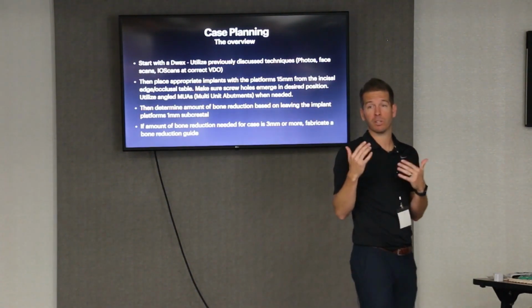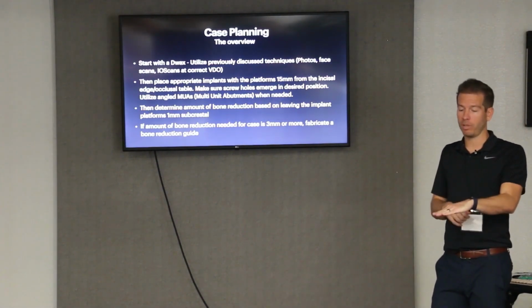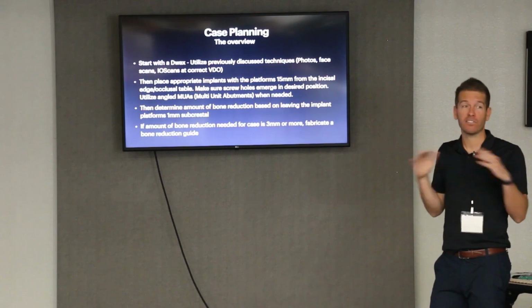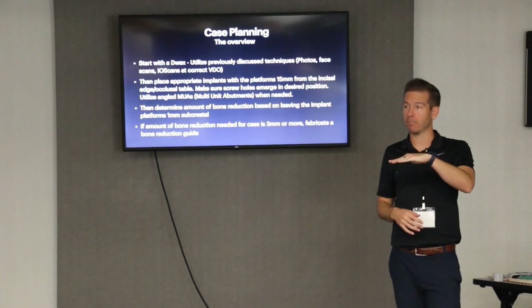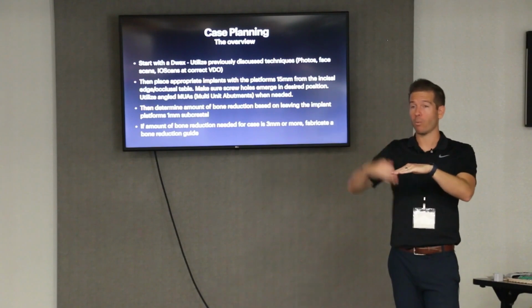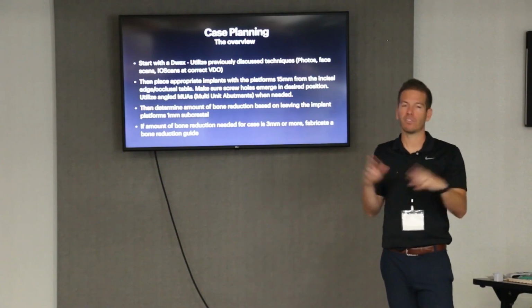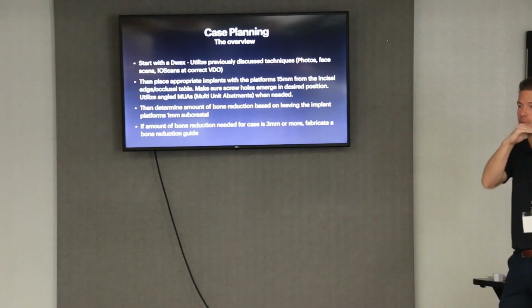And they determine the restorative space too. So, you've got your teeth in there, and now we want to say, okay, occlusal plane, how much restorative space do I want from that? And that's where you control your implant depth. So if you want 15 millimeters of restorative space, you got your occlusal plane of your digital wax up. And that might have nothing to do with their current teeth. Their current teeth might be way below or way above that, but your digital wax up is where your restorative space is driven. So your 15 millimeters or whatever you end up choosing from that is right where your implant platforms are all going to be.